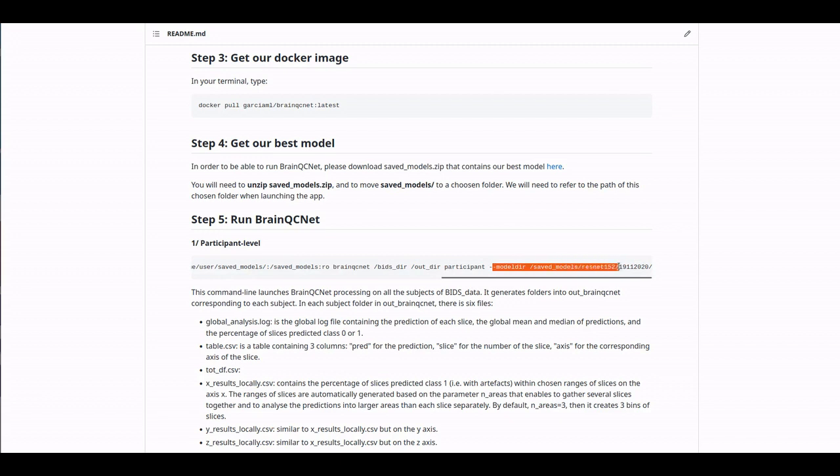Next, you can add many options that are defined in the run.py script. You can see the script in the code in the other repository that shares the code. And that's all. So let's see how it runs and how it performs on two different machines now.